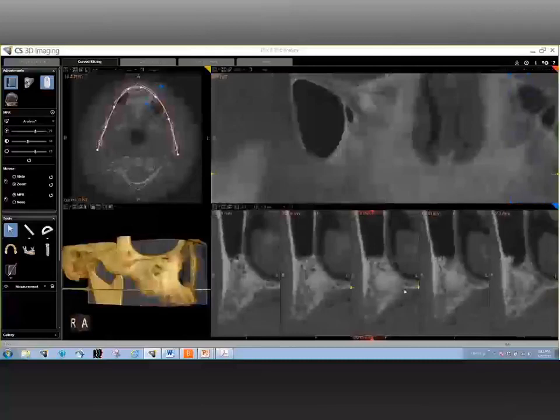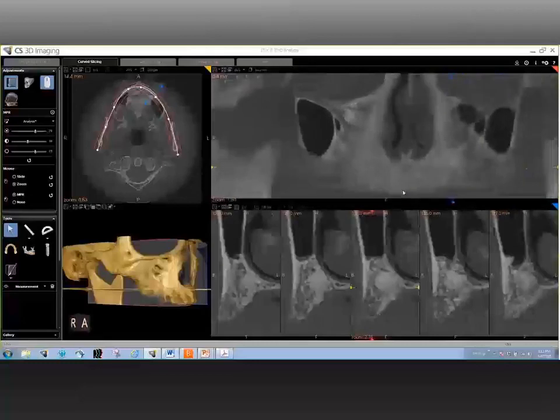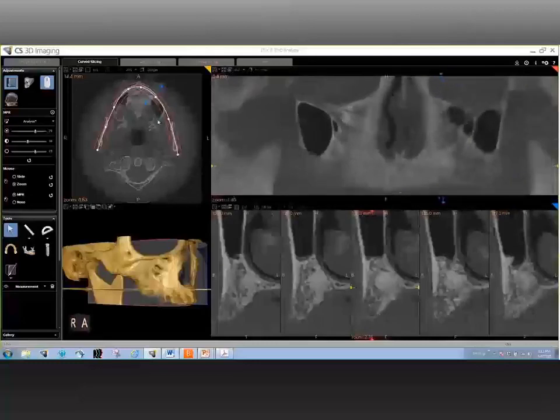So that looks like there was some sort of graft procedure that was done in that area, possibly a small graft, and it seems like the graft is also integrating a little bit. This also shows the importance of having these CBCT images for pre- and post-graft procedures, where you can evaluate the area to be grafted, and post-surgically you can evaluate the osseointegration of the graft to the bone by itself.